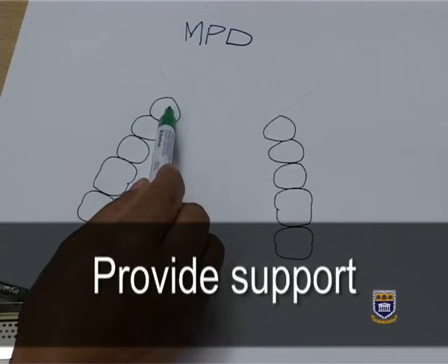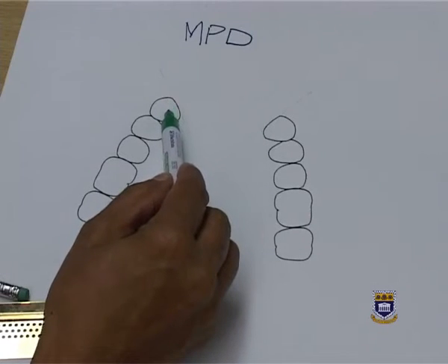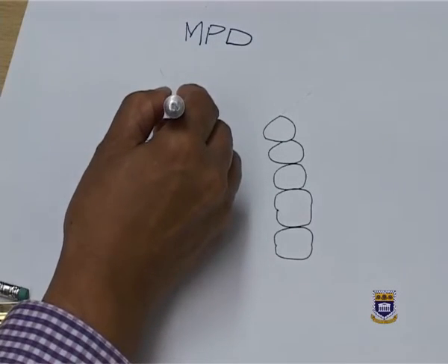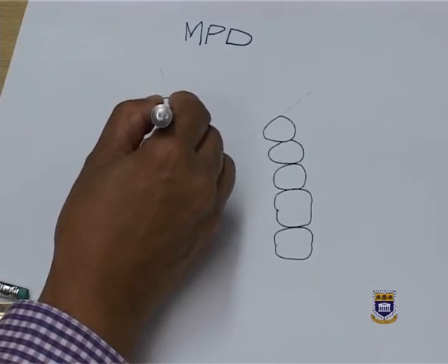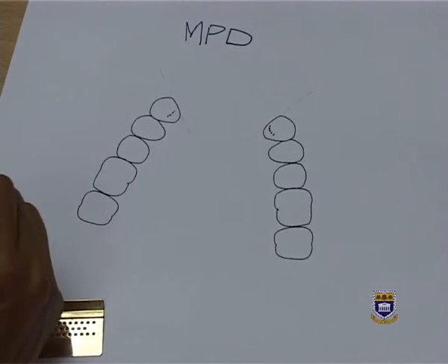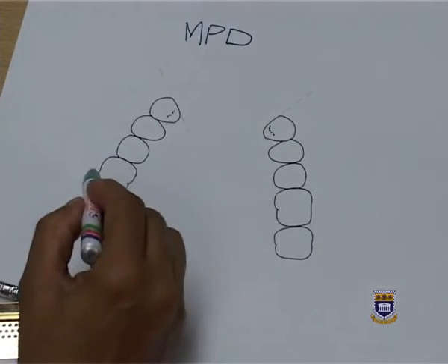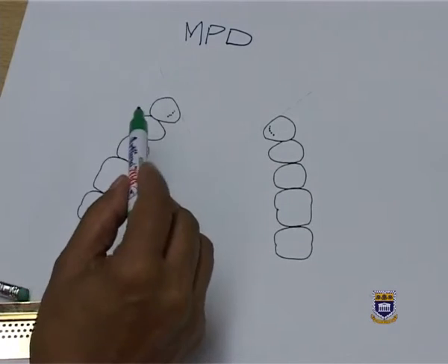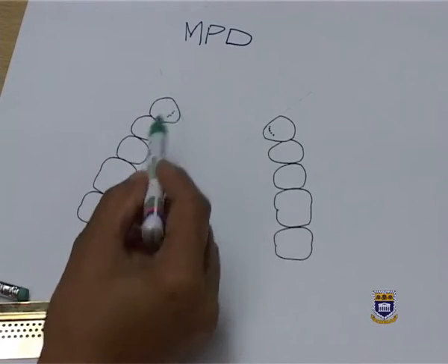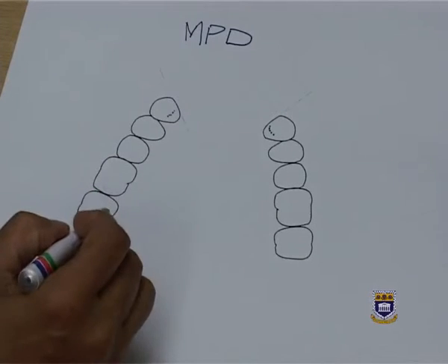Remember, support again has to do with preventing the denture from sinking into the saddle area, because we want a tooth supported denture, not a mucosa supported denture like a complete denture. So the first step is, again, we've got abutment teeth that will provide support. We indicate the support so that we know it's there. And then we know that we will also use our molars for support, because we need 3 rests. Rest provides support. So the support is provided by the 2 anterior abutment teeth, and the clasp, the active retainer that we will use on the molars.